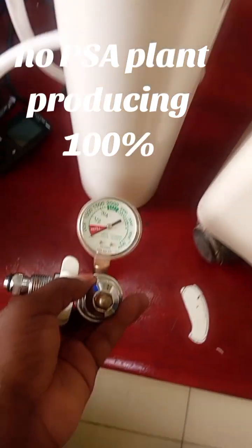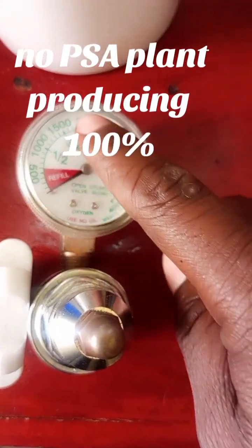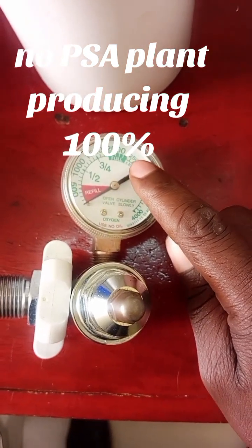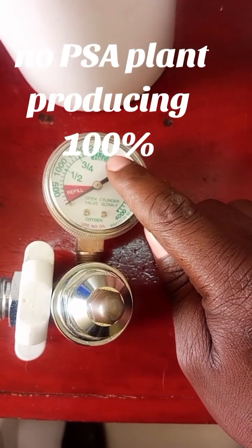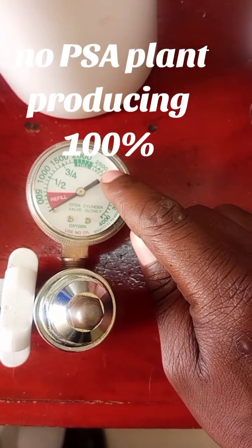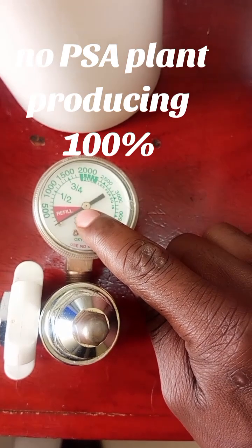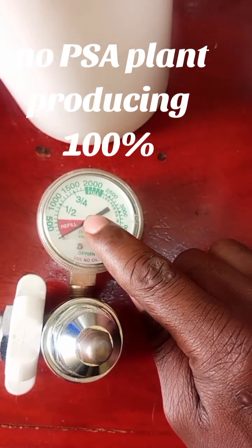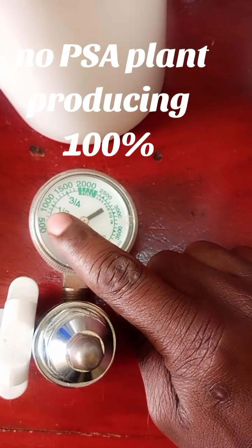Once your oxygen gas cylinder goes above this full point, it creates a very dangerous working zone for the user. So we need this arrow to ensure that when we are using the oxygen gas cylinder, the arrow should only point from this full point down to somewhere in between.